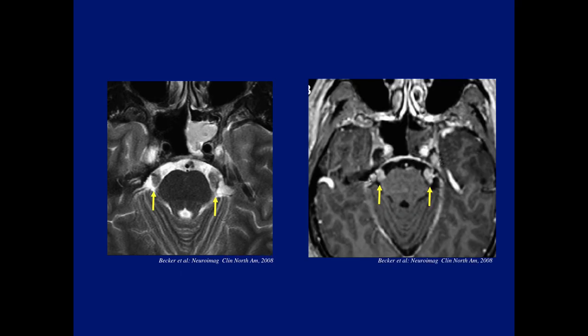Correct. As Eric says, same condition. Again, notice the marked enhancement of the trigeminal nerves. This was another case of a patient with NF2.